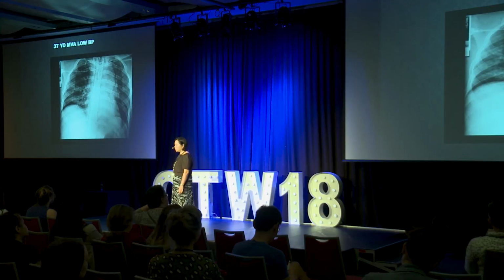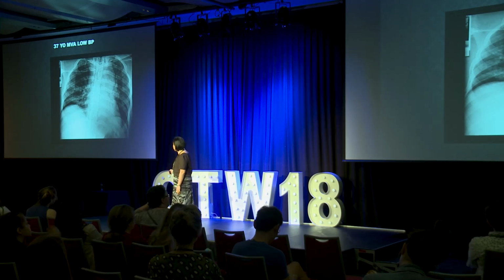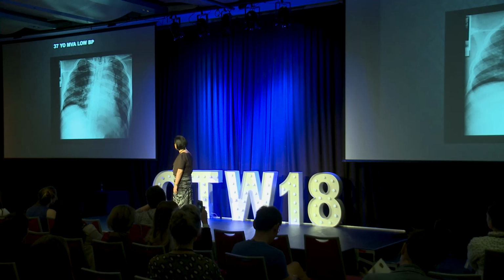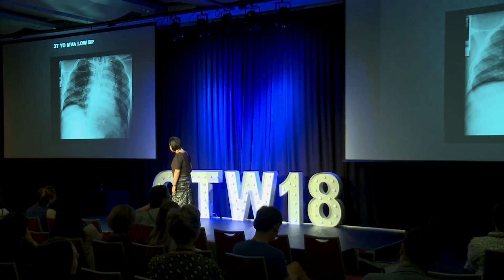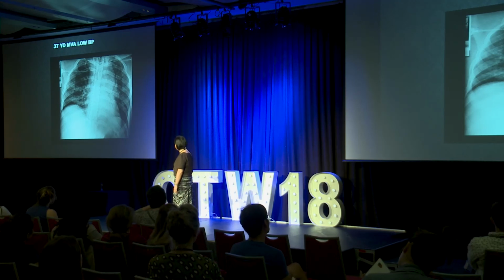So this is a young patient, another trauma case with low blood pressure. So firstly, we look at the lines. So the endotracheal tube looks okay. There's a nasogastric tube. That looks okay. It's gone below the hemidiaphragm. So the lines look fine. Then what next? You know it's a supine film, but this still looks a bit big, right? And then you've lost the normal aortic arch. It just looks like a big convexity, and then it's just fluffy in the left hilum.